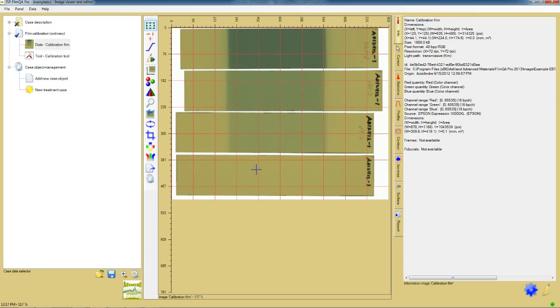The technique of having all calibration films in a single scan is called one-scan calibration. Not only does it minimize the number of calibration images, but it also uses your film and time efficiently. Because FilmQAPro uses rational asymptotic fitting functions that behave like film, that is, the responses approach constant values at high dose, just as the darkening of the film gets progressively smaller with each dose increment, fewer data points are needed to correlate the specific response behavior of film to dose.